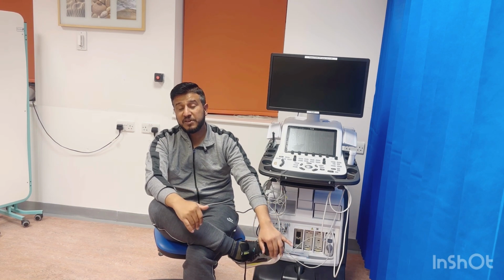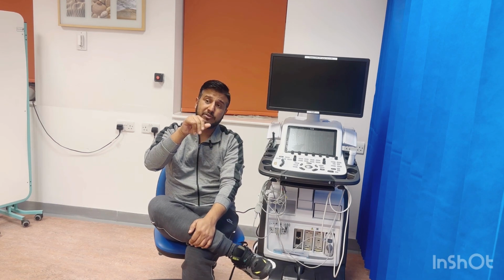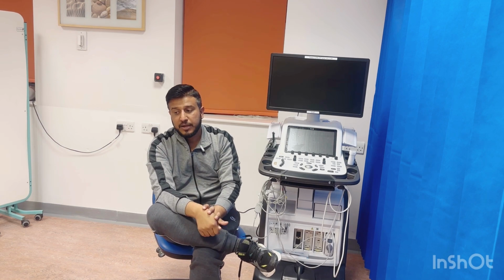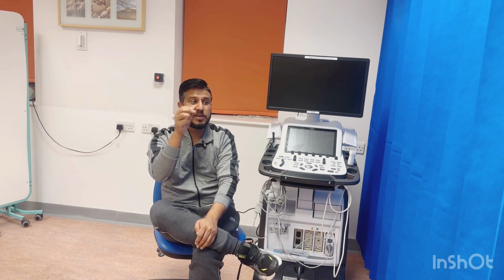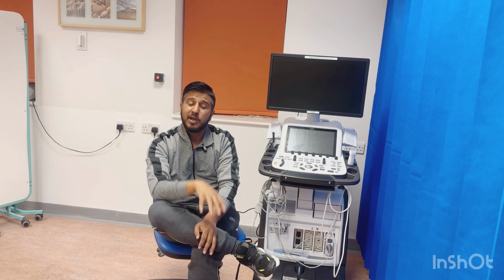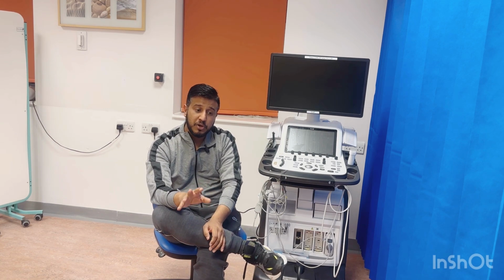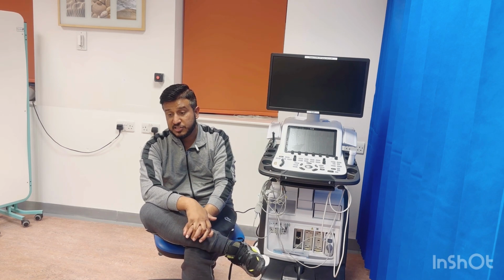So you will do your PISA method. I'm intentionally not mentioning the parameters, like how much the PISA radius should be. I'm not mentioning the numbers, okay? I will show you on the computer later on. So PISA is another method to quantify aortic regurgitation.